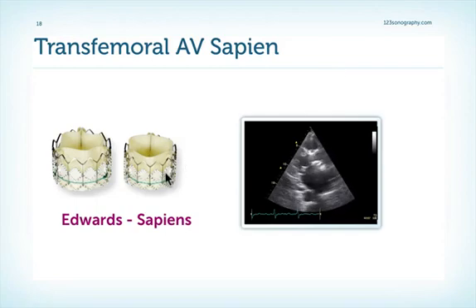The only difference is the stent is not so long, so it looks more like a normal biological valve. Here's such an example. We have the stent here in this region. Very often we have fairly echogenic material here on the top and the bottom, which is the residual calcified aortic valve. And in between we have the biological tissue again.